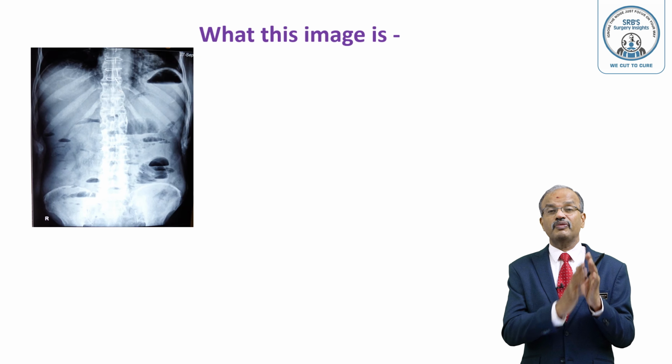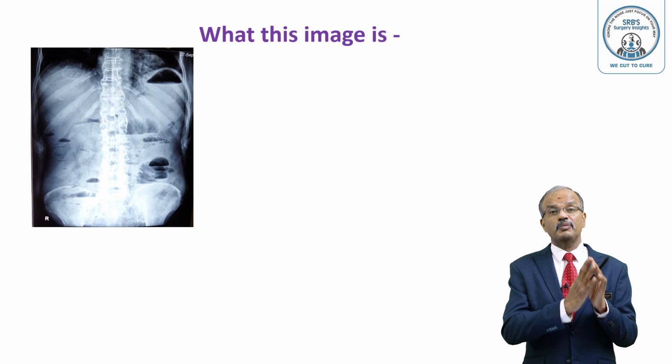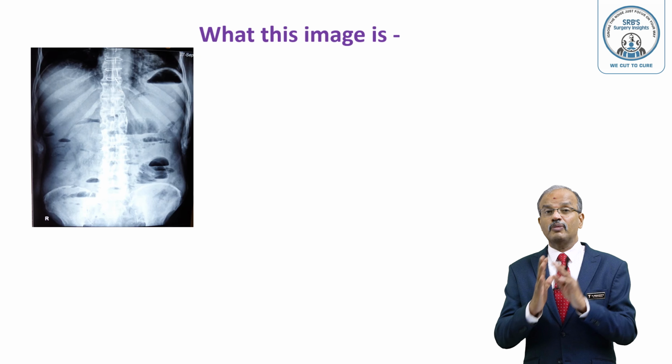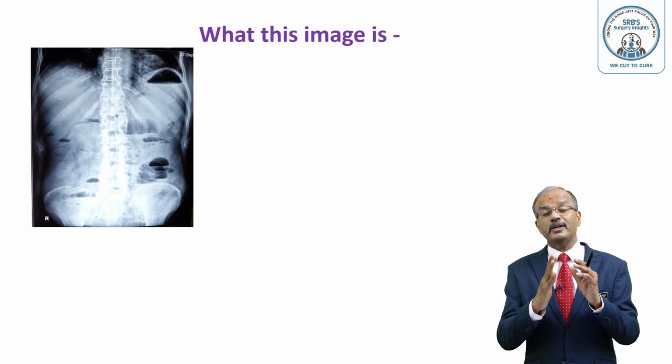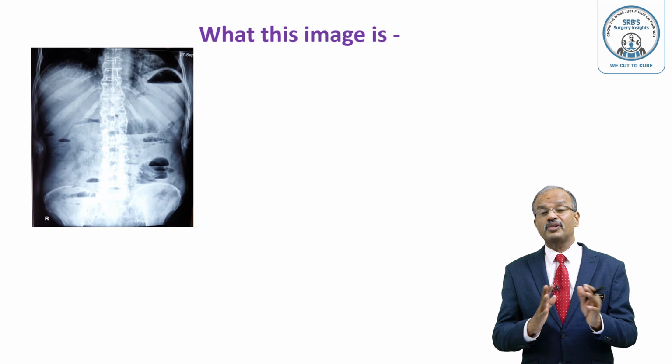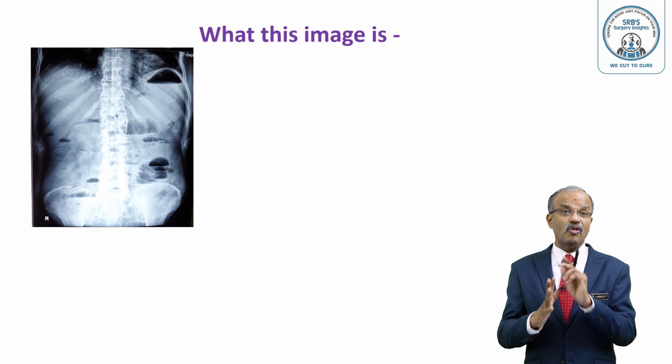There is a technical difference when you write plain X-ray abdomen or plain X-ray KUB. Plain X-ray abdomen is not equal to plain X-ray KUB. When you do a plain X-ray abdomen, the diaphragm should be seen, so your penetration is into the intra-abdominal structures, not retroperitoneal structures. That is the difference you should remember when you write an X-ray form.